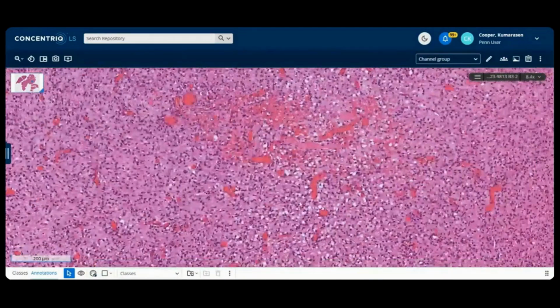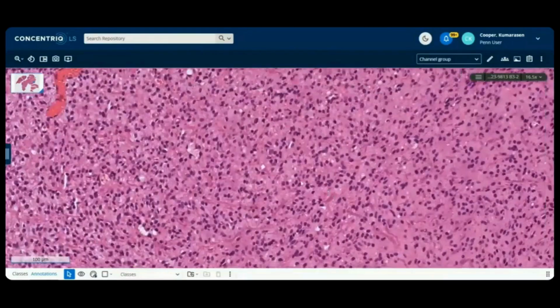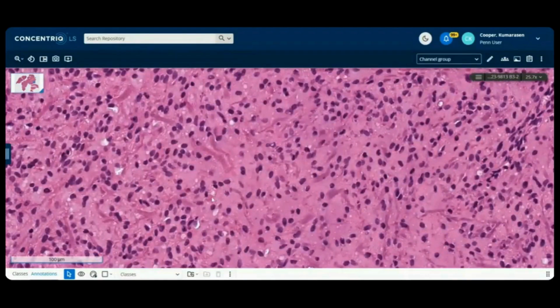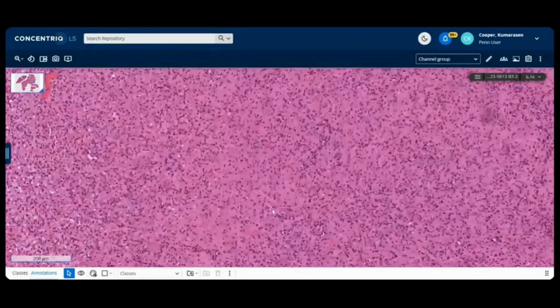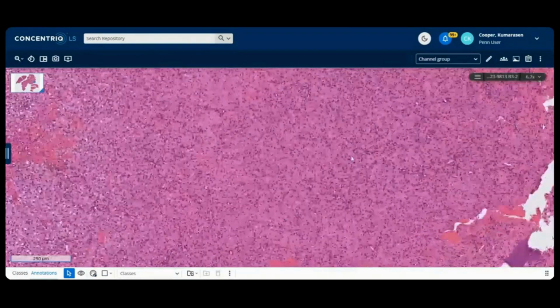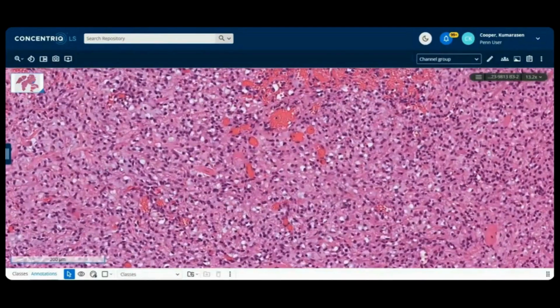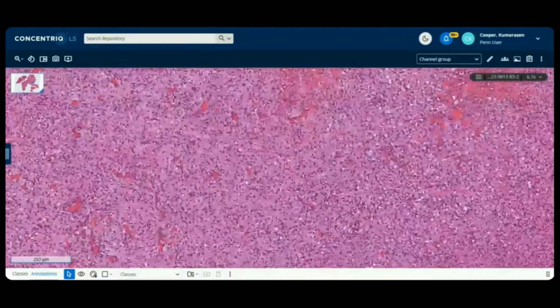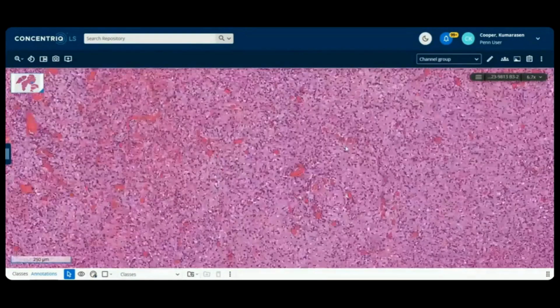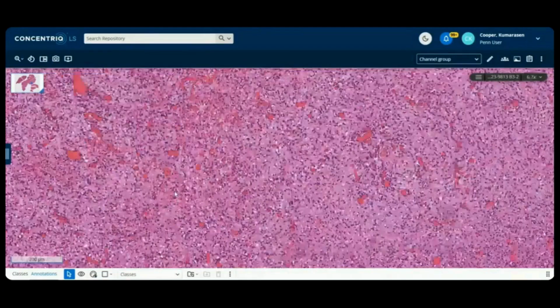You've all addressed it with the usual suspects, which I applaud. Here again, you may say, wow, this is looking a little more like myxoid liposarcoma, but it doesn't have the chicken wire vascularity. Round ovoid cells, it doesn't have, but CD34 and S100 were positive. Now, any thoughts in a young male in the neck with this stroma that's spindle ovoid cell, with the stroma that has this collagen matrix? And I'm looking for perivascular collagen as well. And that's what the books talk about, and I'm trying to help the conversation along there as well. But I cannot find that.